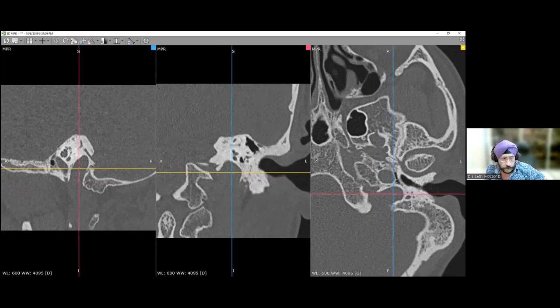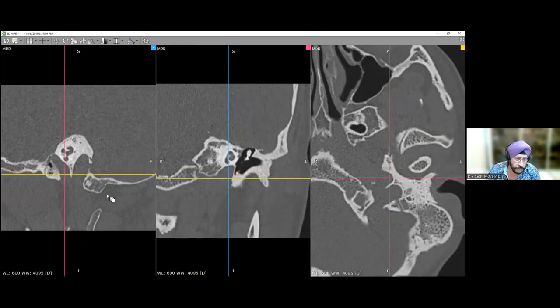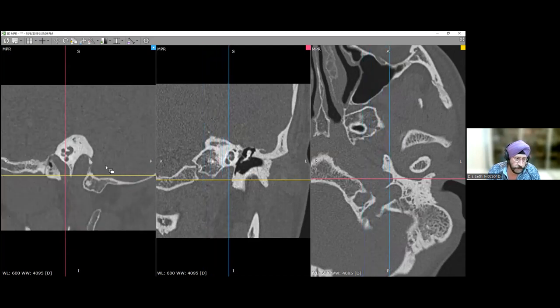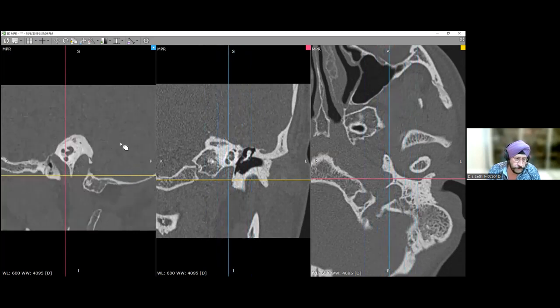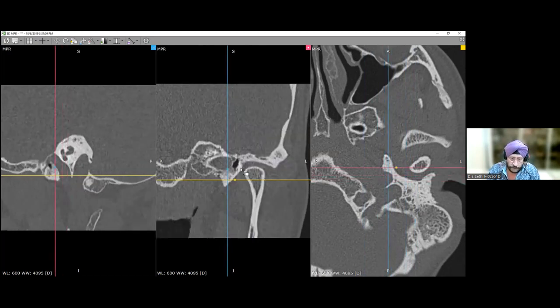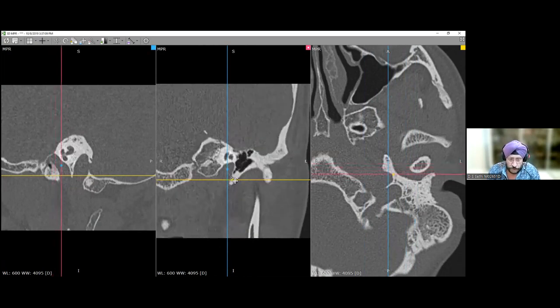And this is the carotid canal. Now, this is what I want to show you. Satish was talking about a small vertical segment, and then it becomes. Let me show you. You can trace the entire internal carotid artery. See that? How it enters here. This is better, I think, than that cut. You can see here entering, this is a small vertical segment.